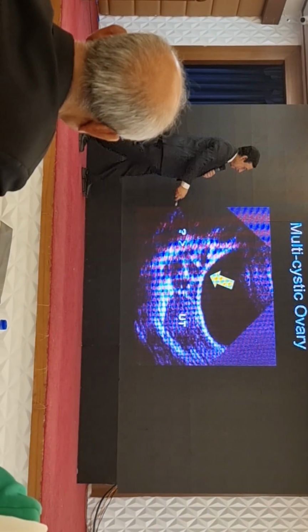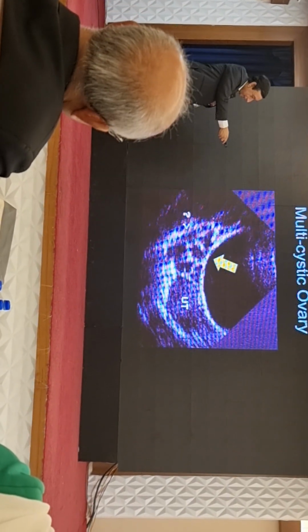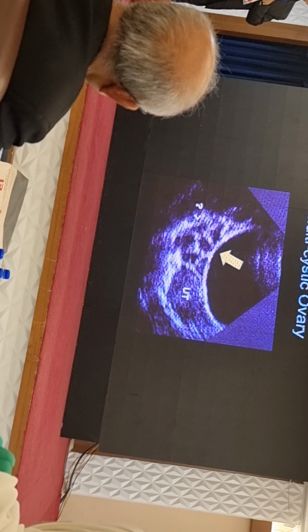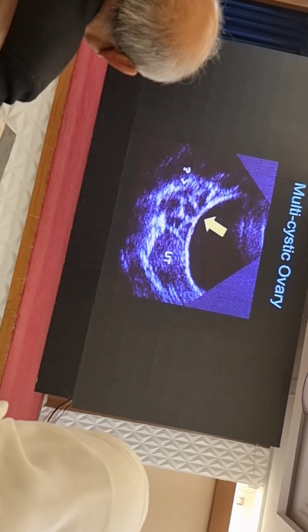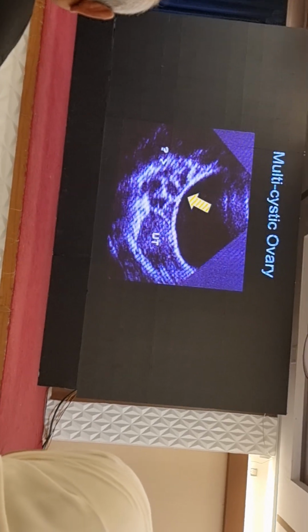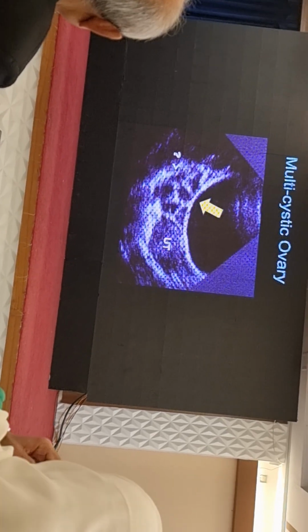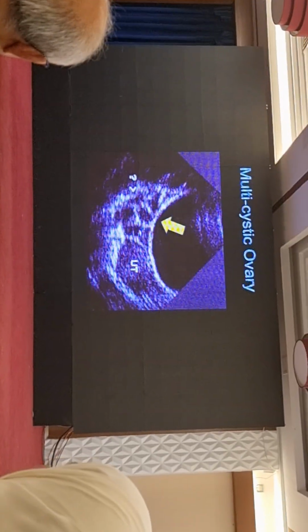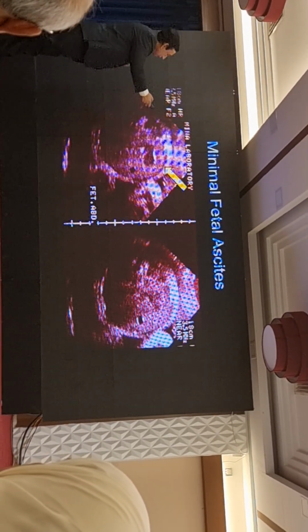Now, this is the uterus. Maybe a multicystic body at the side, maybe. But actually, what is it? If we ask the patient to drink water, sometimes they are so hurried, they take a lot of water at the same time, and this water goes inside the entire intestine. They just move, and sometimes it comes in the pelvis. Some authors have mentioned this in their books also. So this happened. Water.